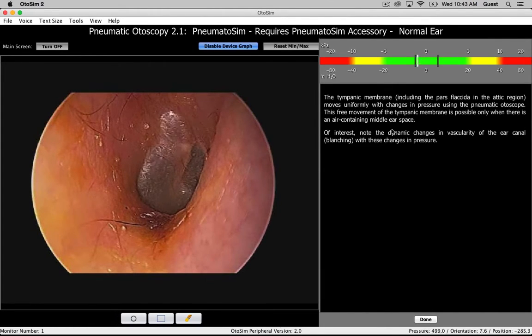And you can see on the top graph, the maximum pressures are actually stored by those two black bars on each side. So if I increase the pressure, for example, I can push the pressure into the red, which we don't want to do, obviously. It'll show me as a student how much pressure I've generated on the positive side, and then I can clear the bars again, start fresh.